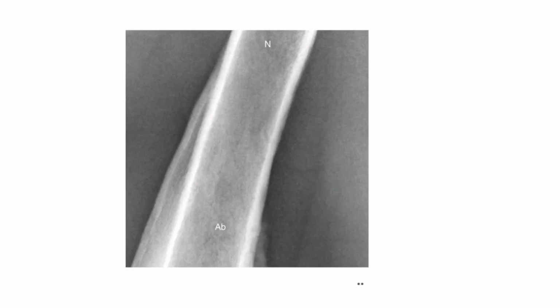So here we have a mediolateral radiograph of the mid-femoral diaphysis of a dog, and we have this really exuberant, smooth, raised periosteal reaction on the diaphysis. Now, because this is a more regular periosteal reaction, our initial impression might be that this lesion could be benign. However, it is quite exuberant.